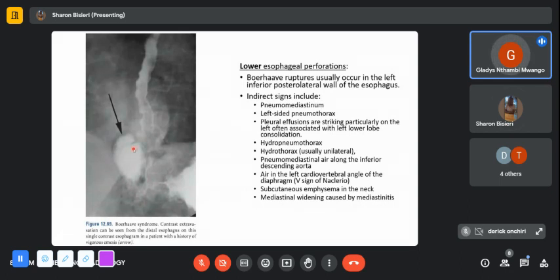What do you think about the rest of the esophagus? It is wavy. What is that? What does that mean? Peristalsis, I just took it to be peristaltic waves. Yeah, these are abnormal peristaltic waves. They're known as tertiary contractions, and you tend to see these more in elderly people. You can call it a normal variant, something that is fairly common in elderly people. All right, thank you.